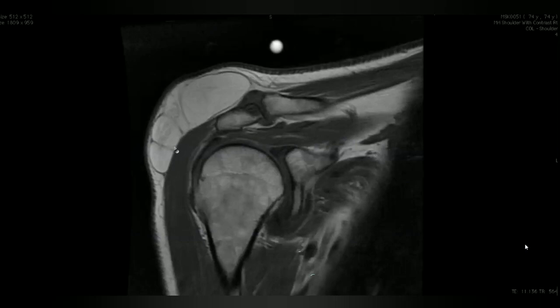I can see a well delineated, well defined abnormal MR signal intensity area along the upper part of the shoulder, that is hyperintense on T1 sequence, and indenting the underlying deltoid. However, the fat planes with the muscles are well preserved, and the underlying bones and muscles, supraspinatus, all appear normal to me. And about this lesion, I can see that some stria and some hypointense areas are also evident within this lesion.